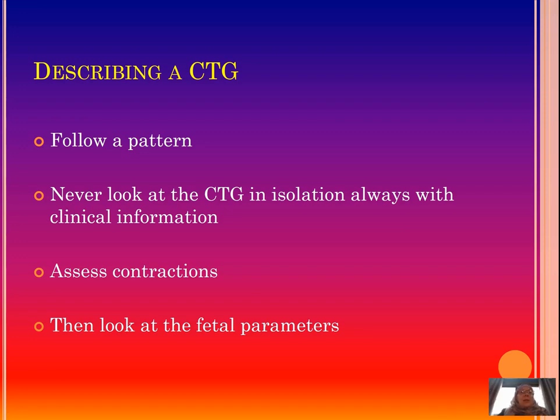You also should never look at the CTG in isolation. You have to look at the CTG in the context of the risk that the patient has. Also in the clinical context. So, is this an antenatal CTG or an intrapartum CTG? Is this patient low risk? Is she high risk? So that you know how to interpret a CTG appropriately and what actions to take in response to a CTG.